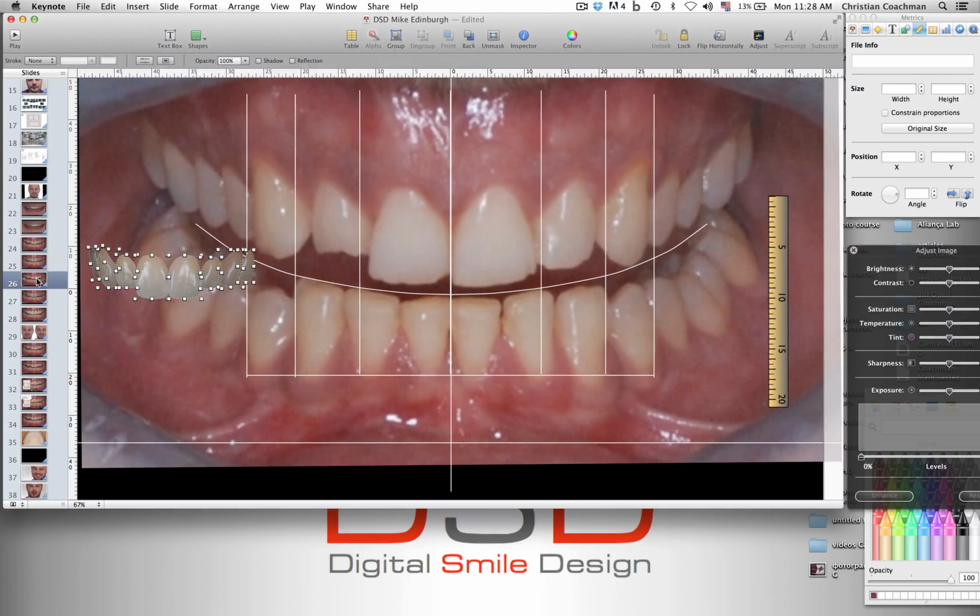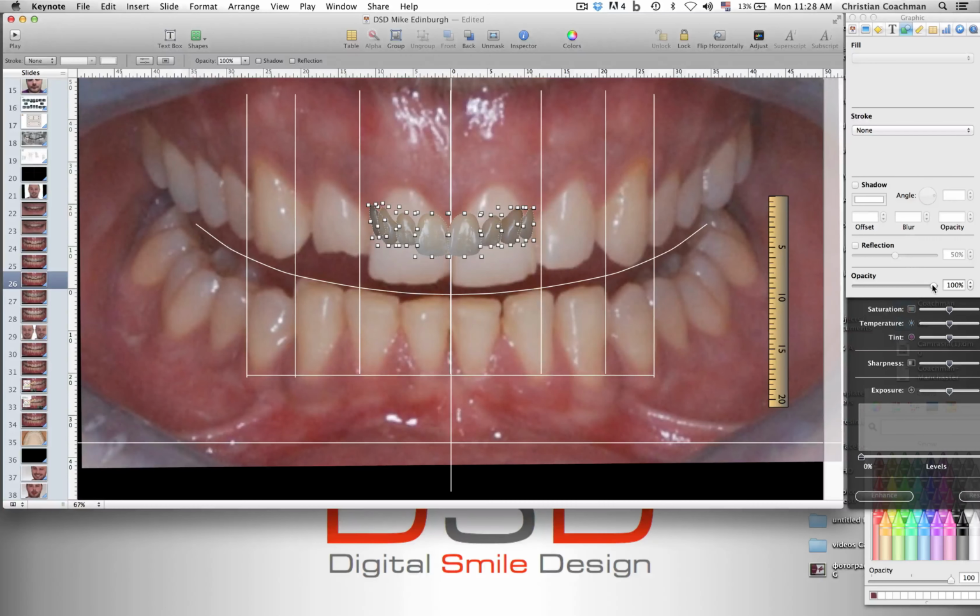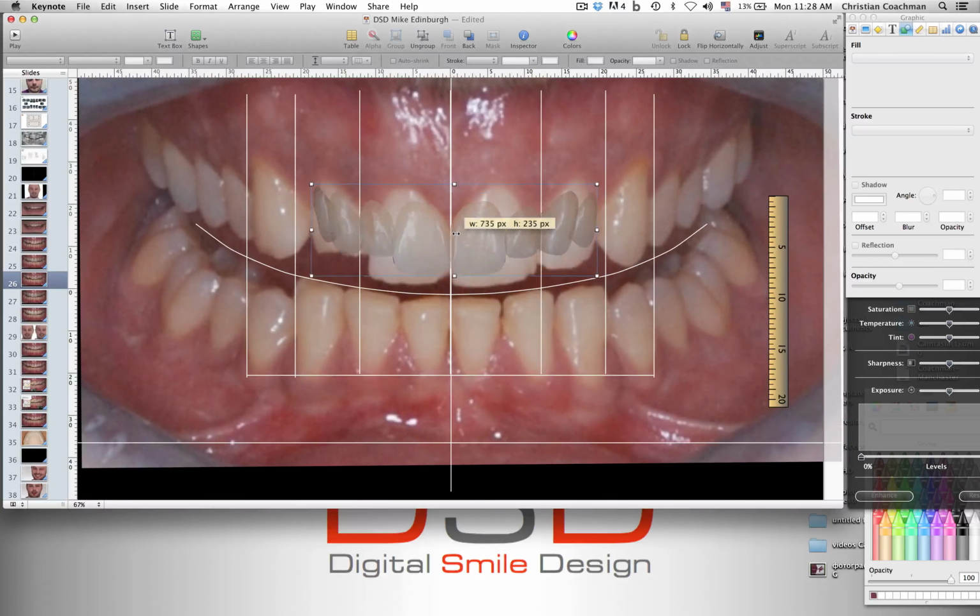Then I can paste them over here. I can put some transparency to see what I'm doing. And I can group them to be able to enlarge them together. See how we enlarged. With the fingers here, we can enlarge on the pad.